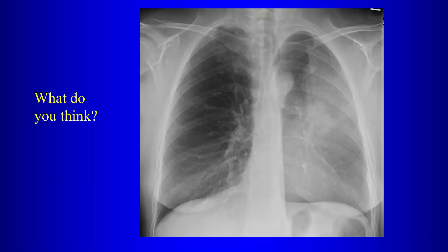Yeah, so we have this abnormal opacity here on the left side. So why are we suspecting left upper lobe collapse? Because you can see lucency at the top. Yeah, so there is lucency. Well, first of all, is there volume loss? You're saying collapse, is there volume loss? Yes or no? Yes. Well, which is it? Yes. How do you know?